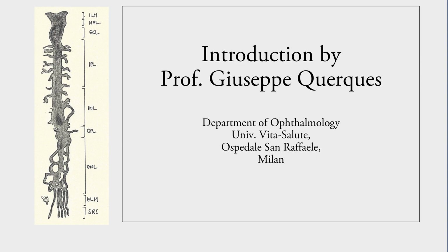This work by our friend Pippo Simona is not meant to make a new research, but it's extremely important because it is a strong recap on all the features that we need to take in consideration every time we are interpreting an OCT. And it's probably extremely useful not only for young ophthalmologists, for young retinal specialists, for residents, but also for skilled retinal specialists because of its important aim to make the point and to recap all the features.